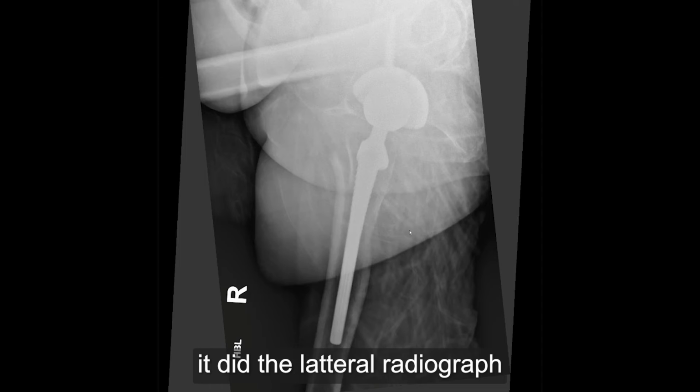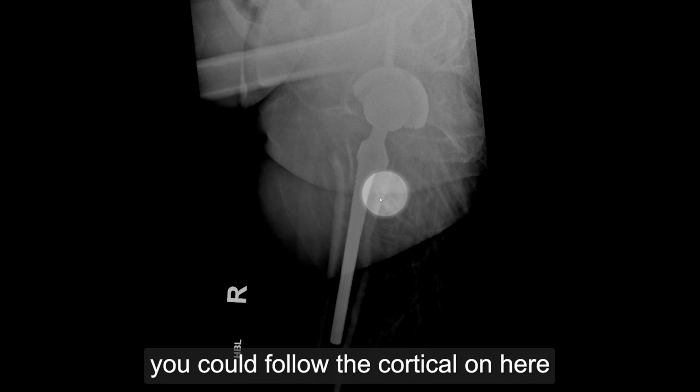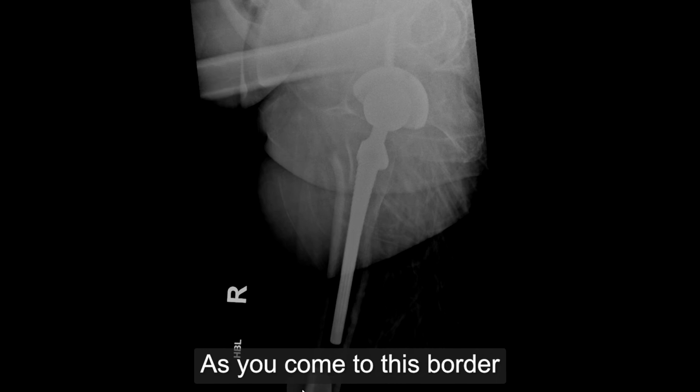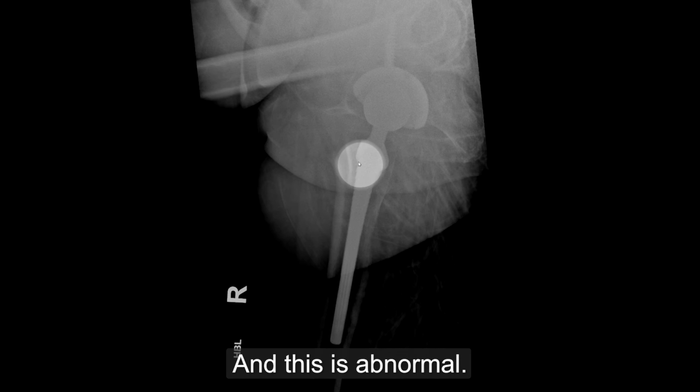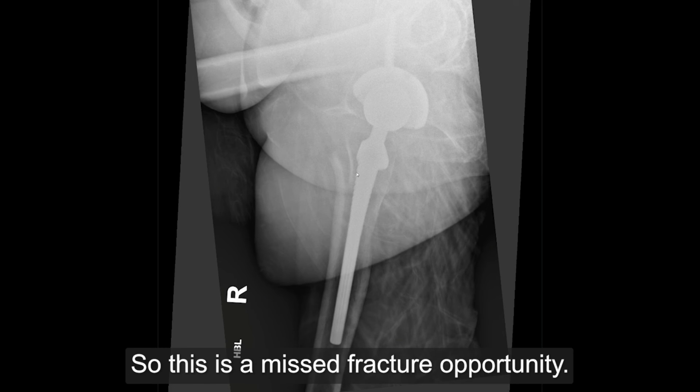They did a lateral radiograph and they couldn't see the fracture. Although if you apply the same rule, you could follow the cortical line here, all nice and smooth with no steps or abnormality. As you come to this border and go all the way up, you can see double cortices. And this is abnormal. How would you see double cortices unless there's a fracture? So this is a missed fracture opportunity.